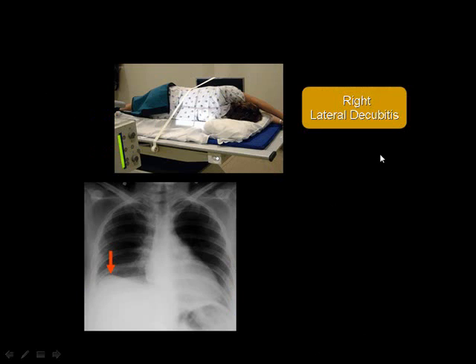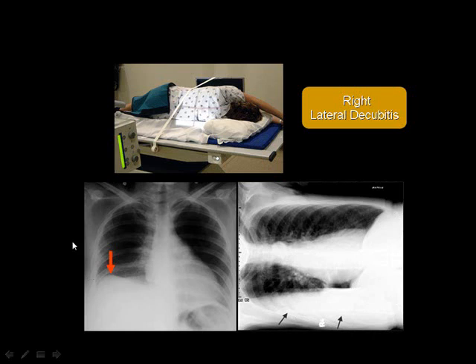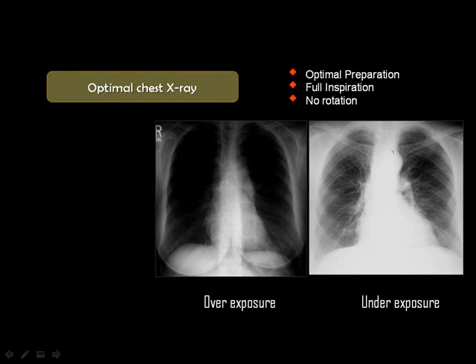And this is an old technique which is known as the decubitus film, and we use this technique whenever you see this finding in the frontal chest X-ray. What is this finding? You see the diaphragm is elevated, and the highest point of the diaphragm is a little bit shifted to the lateral chest wall. Whenever the diaphragm is elevated and the apex is shifted laterally, you know that there is some fluid underneath the lung, what we call the subpulmonary effusion. If the patient lies on the right side, then the effusion will come into the pleural recess. But nowadays you can confirm this diagnosis simply by ultrasound.